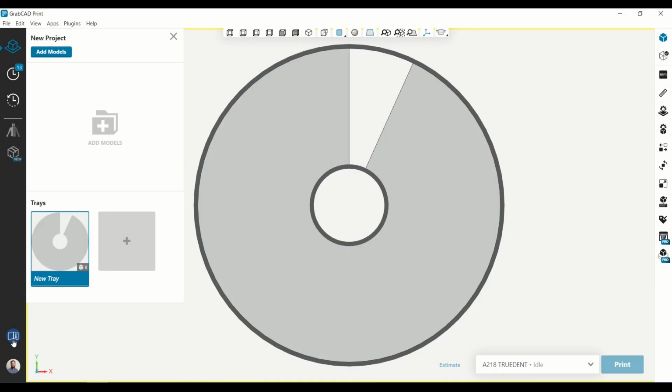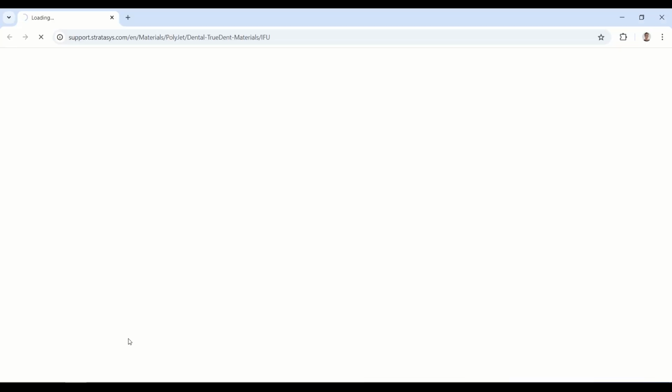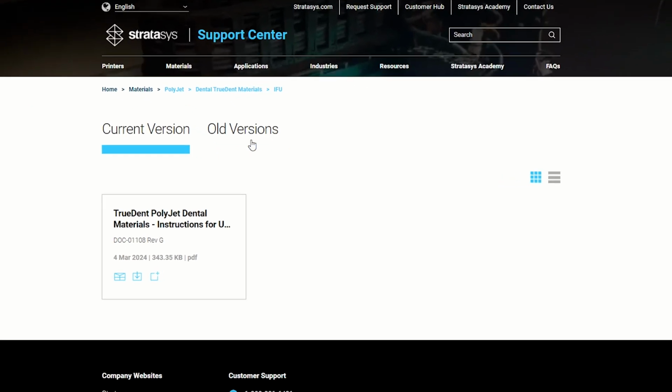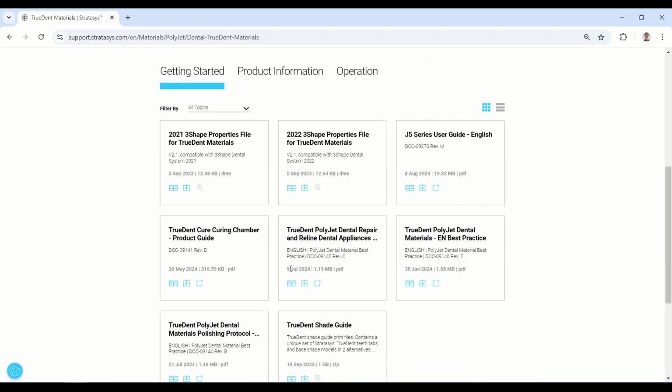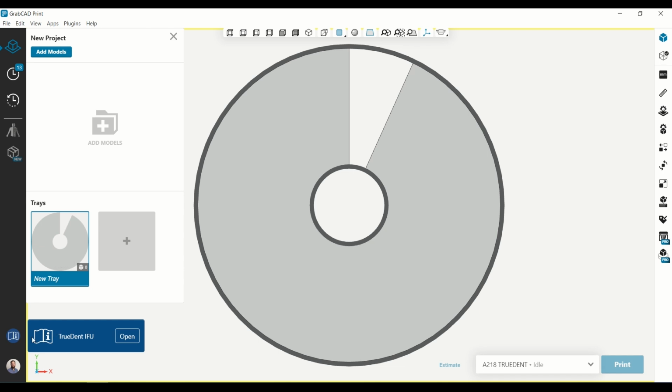All the instructions I'm going to talk about in this video are also available in the IFU, Instruction for Use document, available here in the Stratasys Support Center website. Other information, protocols, and guides are also available in this page, the Dental TrueDent Materials page, which has the polishing protocol, the repair and relining protocol, and much more. Let's hide it for now and start with the demonstration.